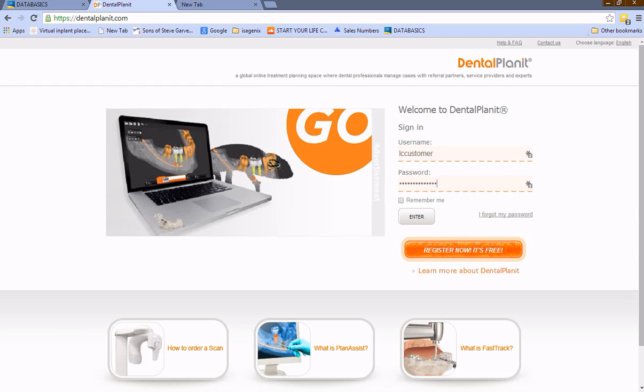Hello everyone, and in this video today we'll be taking a look at how to order a conversion using DentalPlanIt. The first thing we need to do is to register for an account if you haven't already done so, and then we'll just enter it here using a test account.